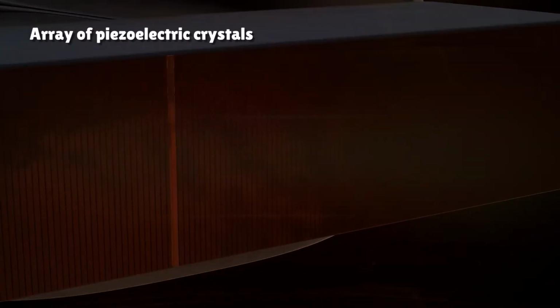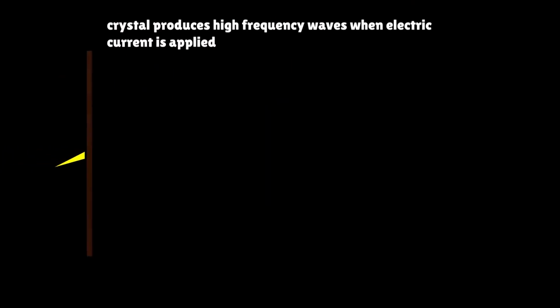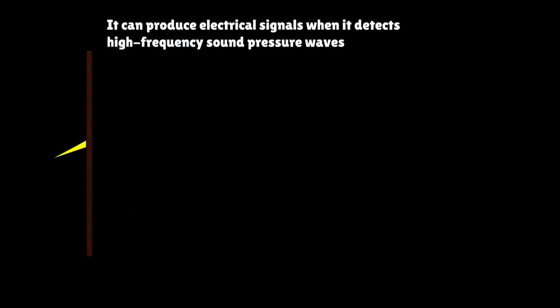The heart of most ultrasound systems is a device called a transducer, which uses an array of piezoelectric crystals. The working of a piezoelectric crystal is that it vibrates when an electric signal is applied, producing high-frequency sound pressure waves, which we call ultrasound. More importantly, this type of crystal can also work in reverse. It can produce electrical signals when it detects high-frequency sound pressure waves.